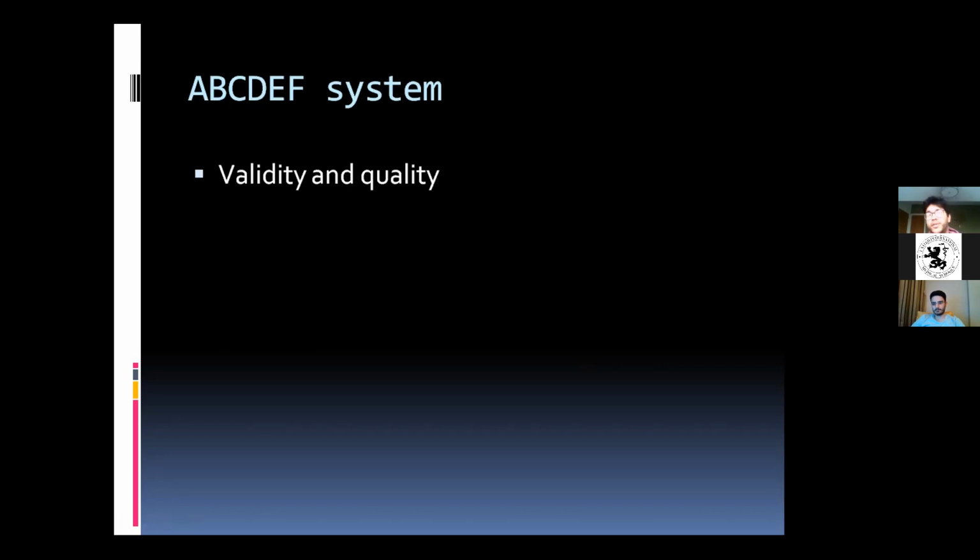A couple of points would be if it's a PA or an AP, and if it's a good quality chest x-ray in the sense that all the main points are covered. So for instance, can you see the first ribs? Can you see the diaphragm? Can you see the costophrenic angles? Can you see the edges of the pleura? These are the main things that allow you to proceed to an accurate interpretation of the x-ray itself.